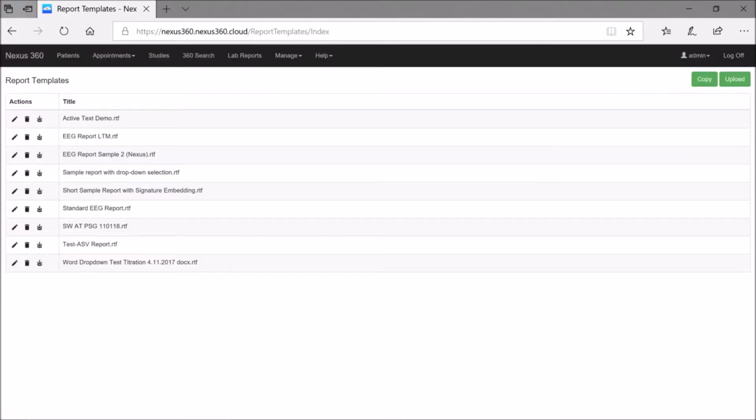What I want to show you here is the report wizard. And the report wizard is something very powerful that's basically developed by Compumedics. Compumedics are one of the only companies, if not the only one, to supply this sort of tool for Profusion report writing, which basically means that you can have an easy wizard tool that inserts the relevant code that you require. So if you just need to insert a code, you don't have to call Compumedics and ask us to do it for you. Okay.